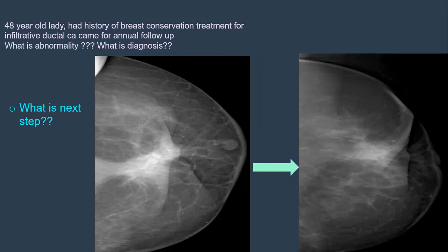You cannot say advanced because of positioning. Here nipple in profile and there is retraction, but the nipple here is within the breast. It's difficult to tell, but there is some irregularity around and wrinkling of the areolar skin due to retractions of the post-operative. But you can consider the dense area of asymmetry. This area of asymmetry now definitely is getting less in size and intensity.